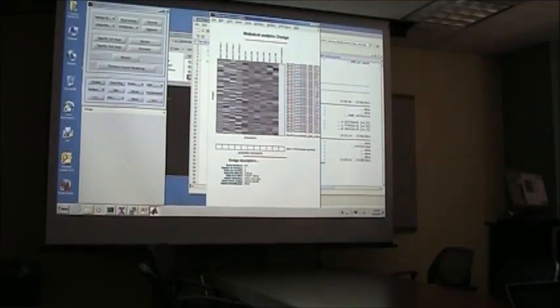Okay, I just want to have a look. So we ran the model now and estimated it. This is what it looks like. You have this button here to review your model. And again, one of the slides, the picture might look similar to this. This is sort of a grayscale image of how your model looks.